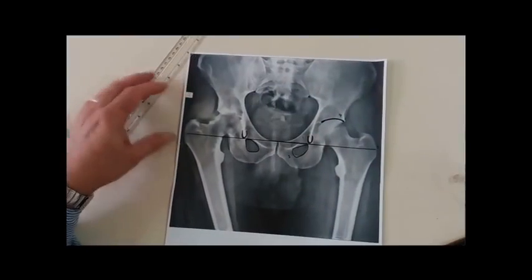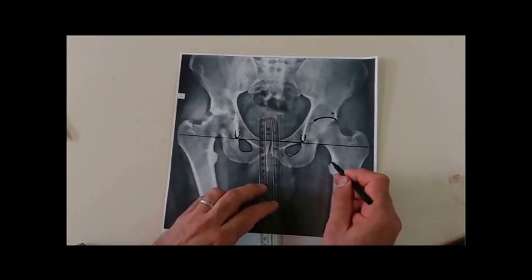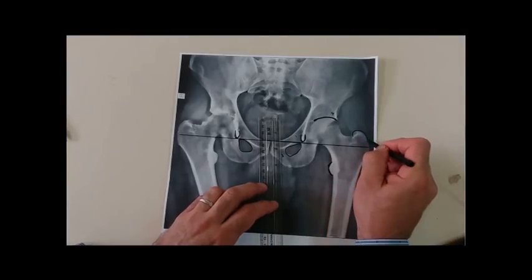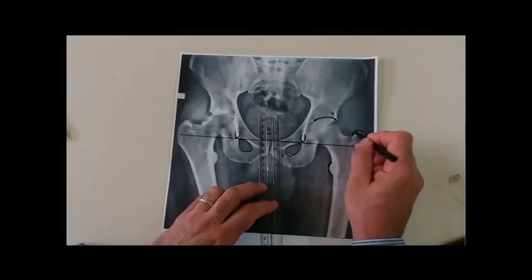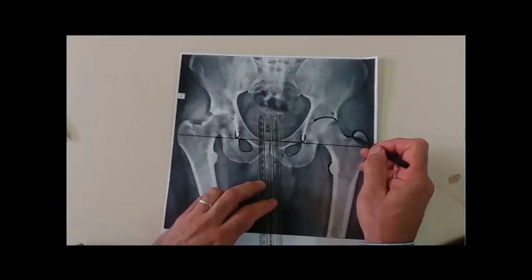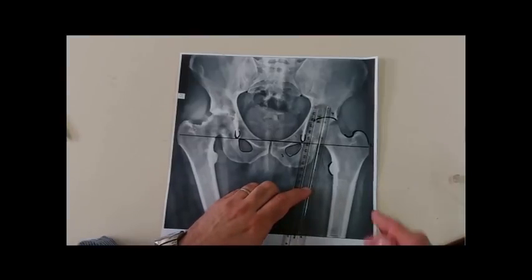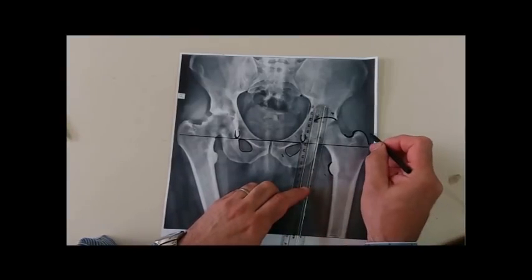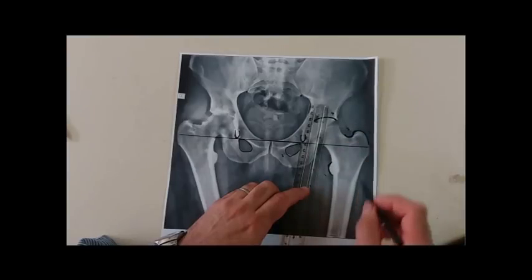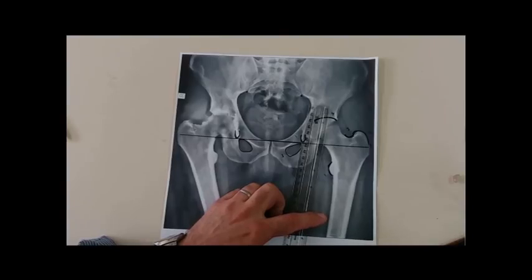What about the femoral side? On the femoral side, four bony landmarks also should be fixed. This is the lesser trochanter. This is the greater trochanter. And the saddle area. The saddle area is important because it is easily palpated perioperatively, so that we can make it a reference line or reference point. So the first one is the lesser, the second is the greater, the third is the saddle, and the fourth is the intramedullary line of the femur.